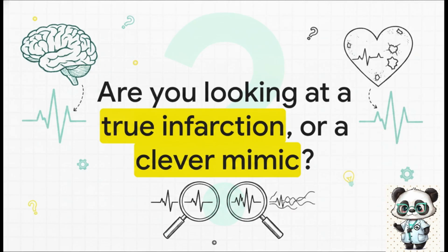Mastering the morphologies we discussed today is your absolute best defense against being fooled. Keep training your eyes, stay curious, and I'll catch you in the next explainer.